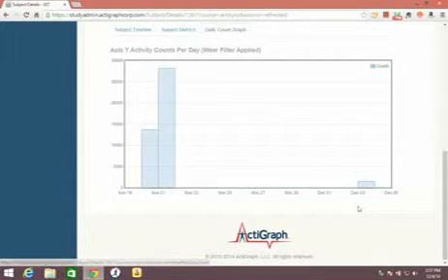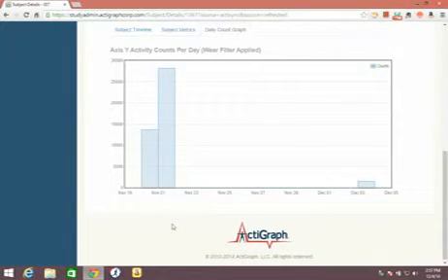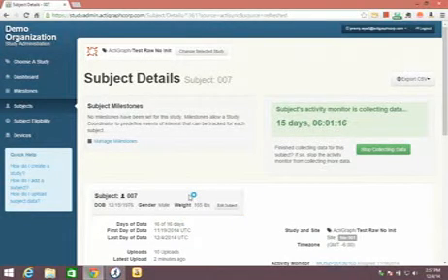to show a demo. But what is interesting is how do we look at this data, not only in Study Admin, but also in ActiLife. I'm used to seeing subjects in ActiLife. How do I get this data back out and into ActiLife and look at it in 60-second epoch form?